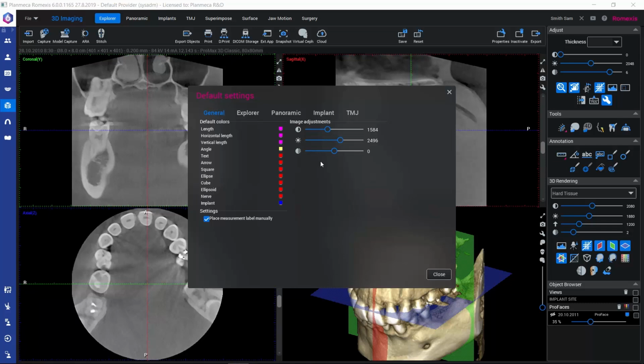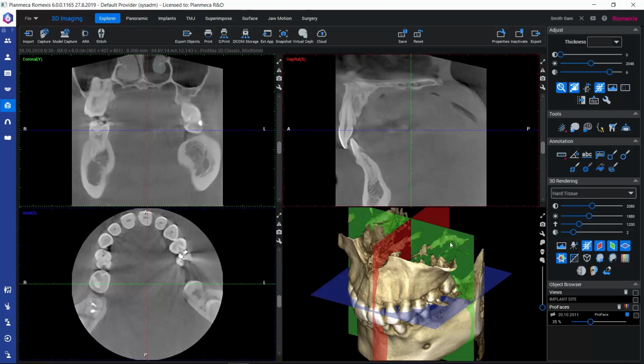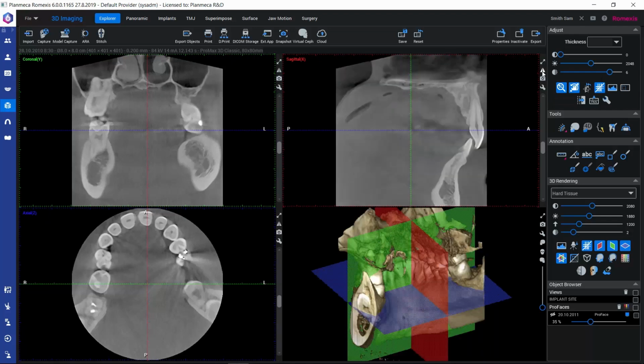So these we should set on the image capturing computer in order to apply our preferences on all the new images taken. And furthermore, if we would prefer seeing the data mirrored, we can use this mirroring icon here next to each of the slice views. So this would mirror the image that we see here in the view.